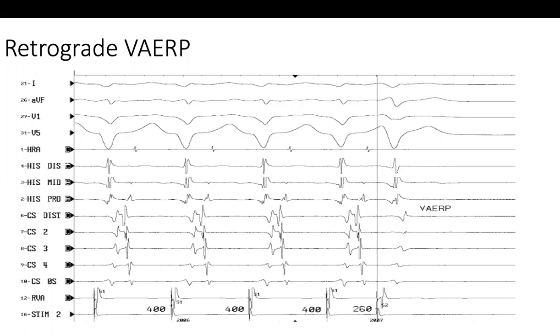Left atrium. And how do you convince me about it? We follow HRA up. Yes. And then HRA was activated after the LA. So this is LA, left atrium, and this is right atrium. So the left atrium was activated before the right atrium. Yes. So this is an accessory pathway conduction. Yes. Good. So the same happened in the 1, 2, 3.